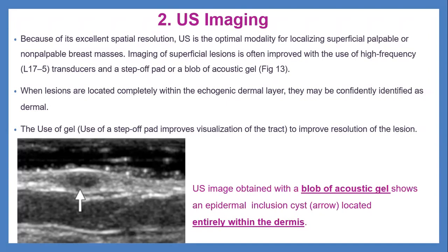If the lesion is seen completely between the two layers, epidermis and dermis, it will be clear that this is a skin lesion seen within the dermis.